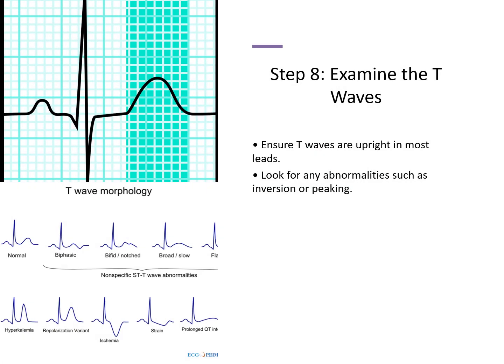Next, examine the T waves. Ensure they are upright in most leads. Look for any abnormalities such as inversion or peaking, which can indicate issues like electrolyte imbalances or ischemia.